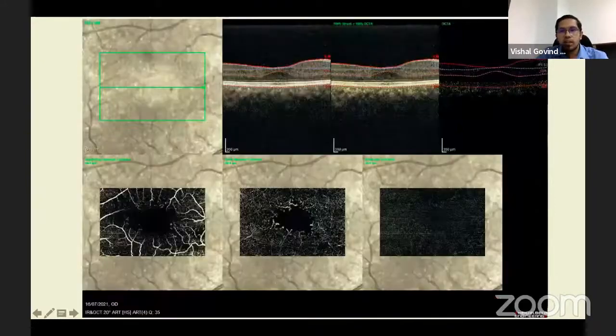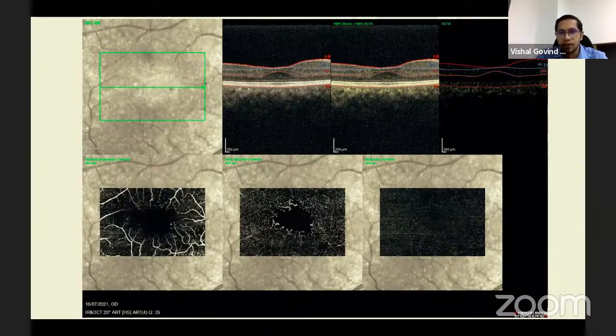But when you look at the OCTA, it's quite clearly showing the pruning of the vessel margins with aneurysms and a very enlarged FAZ and increased intercapillary space. So this is telling us why the 6/24 is happening here and what we have to work with the patient. So these were two cases where OCTA very clearly diagnosed DMI.